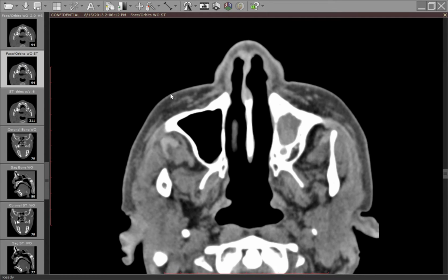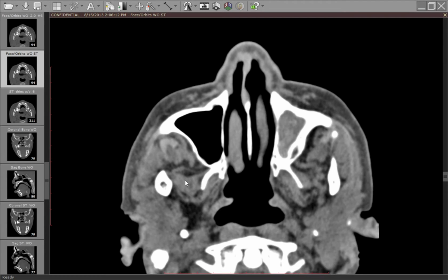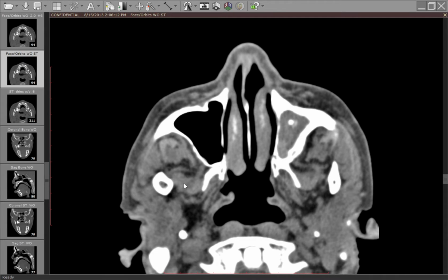So first let's find the pterygoid plate. So there's the lateral and medial pterygoid plate, and the lateral aspect of the lateral pterygoid plate is the attachment site for the lateral pterygoid muscle. So right here, this muscle that in this case is going from the condyle to the lateral pterygoid plate, that is the lateral pterygoid muscle. Now usually it is more in this orientation because normally the condyles are back here, but you can see that it is the contraction of this muscle bilaterally that pulls the condyle forward and normally opens the jaw, but in this case dislocated the jaw.